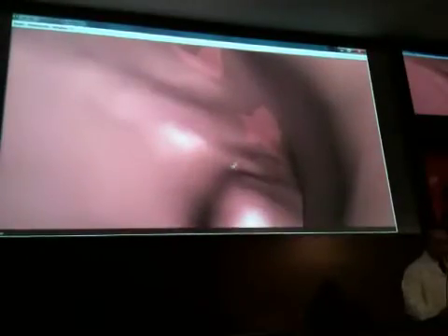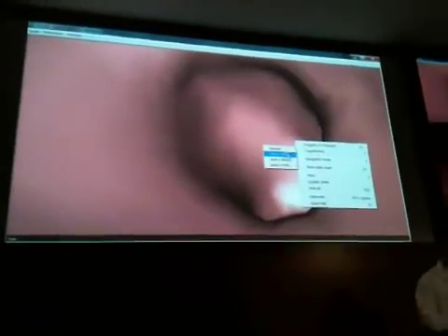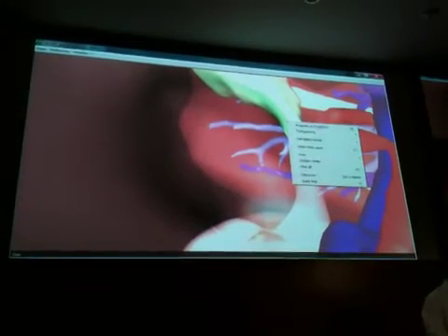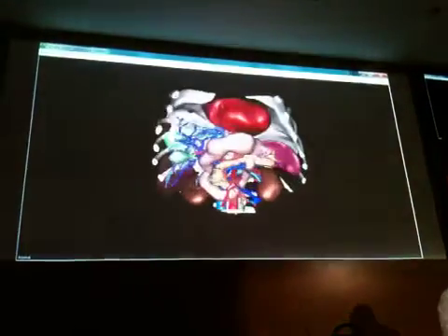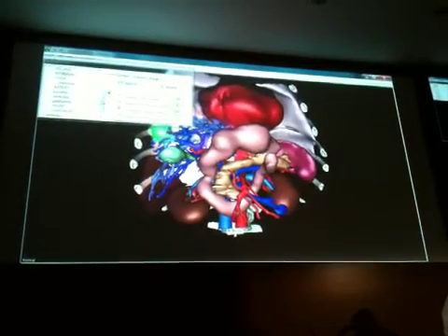You see here, I can perform my virtual navigation in the stomach without any problem. And what I can do is, for instance, put the stomach under transparency. And you see that if I go outside here, I come immediately to the biliary tract. So you see the great benefit of this virtual reconstruction is to provide you the possibility to plan anything. When I say anything, it's also the tool positioning for laparoscopy.